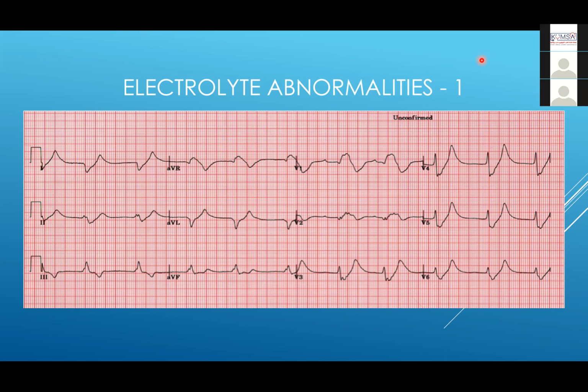Hyperkalemia. Excellent. Who was talking? Munira. Hello, Munira. So what makes you think that it's hyperkalemia? Elevated T wave. Okay. Is there anything else that you want to add? Okay, no problem. Let's interpret this without assuming that it's hyperkalemia.